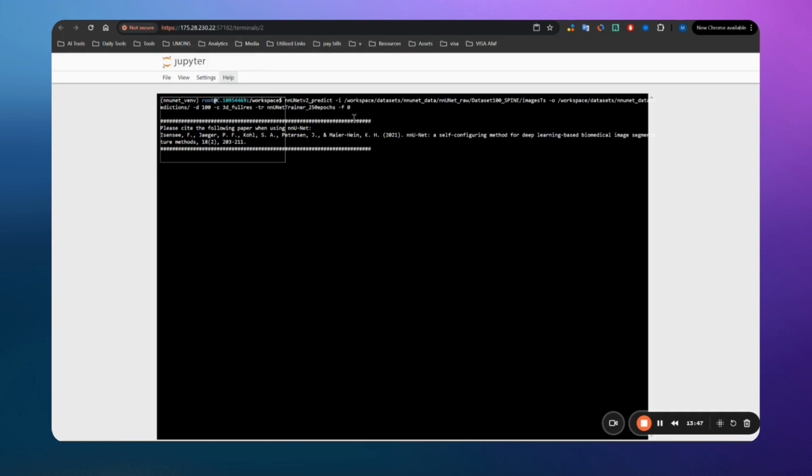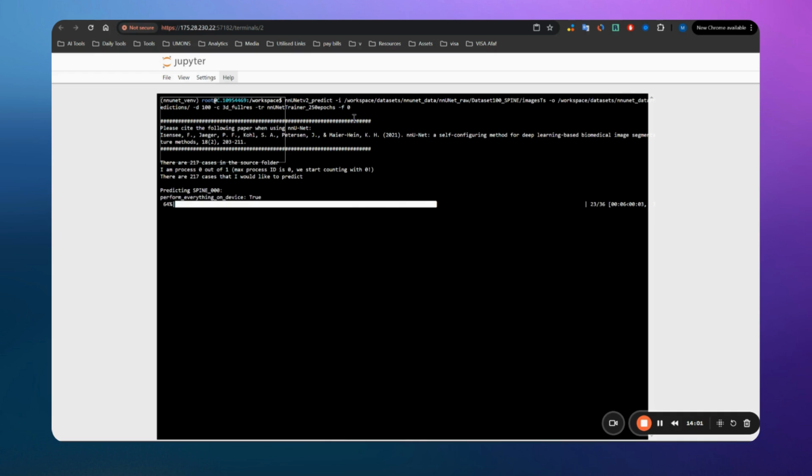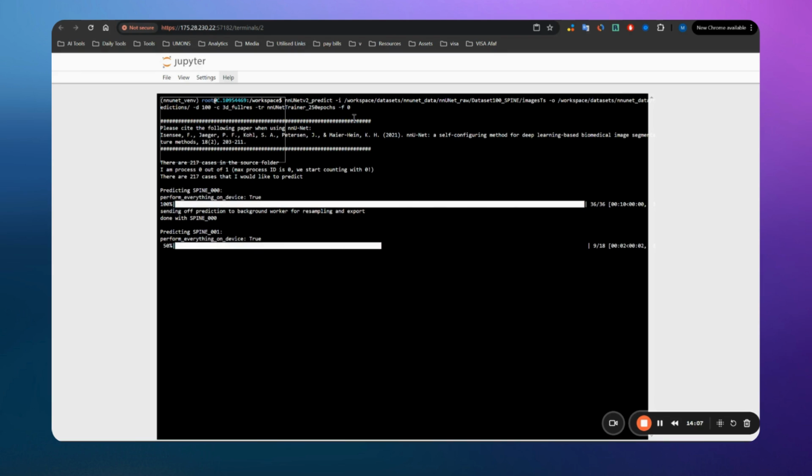This can take some time to do the prediction. We have here, as you can see, 217 cases, which is not something that will run in one minute. The prediction itself is not taking a long time, but since we have a lot of cases, it will take a while. So I will just stop the video until everything completes, and then we can run the evaluation.